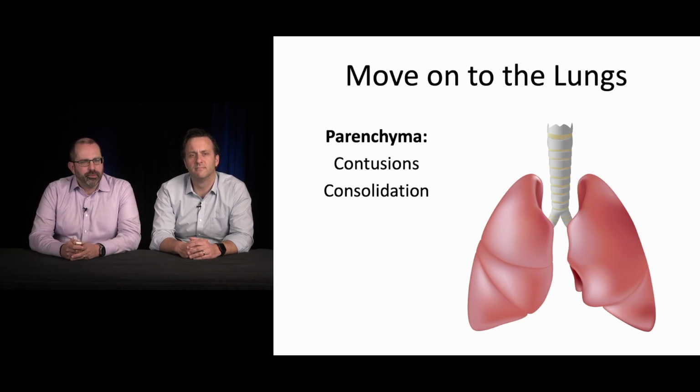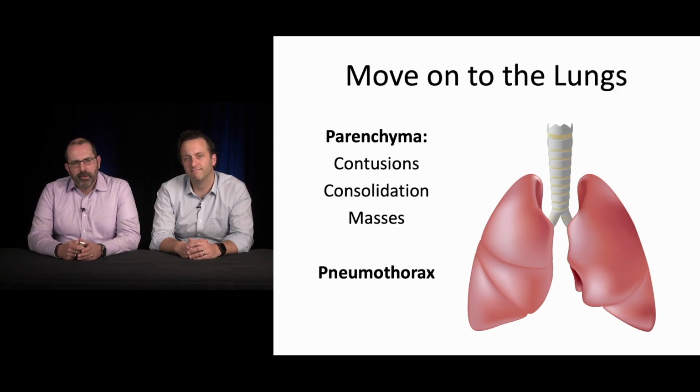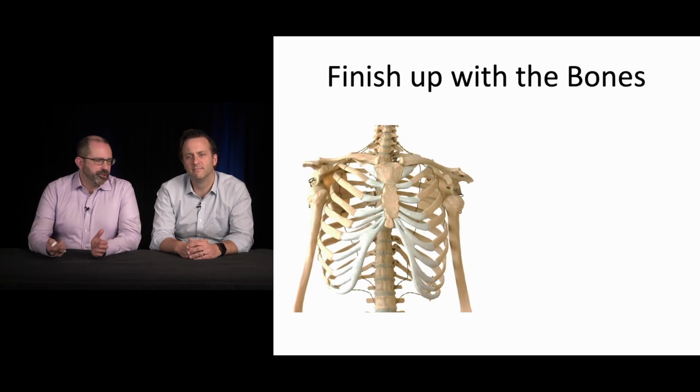We're going to look for consolidations. We're going to look for contusions. We'll look for some masses. That's probably not going to kill them quick, but, and then things like pneumothoraces. And then we're going to finish up with the bones.